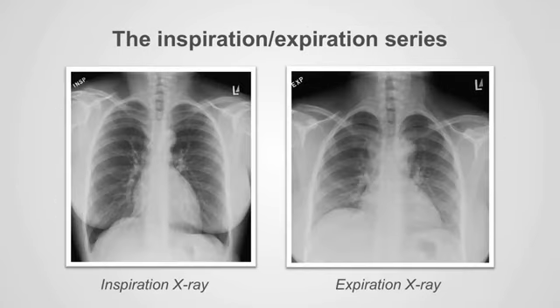When the patient takes a limited inspiration, the opacity of the lungs will be greater than during a full inspiration because there is less air within the lungs. Although in most scenarios this is not desirable, it is used to our advantage in patients with a pneumothorax. By making the lungs whiter, by taking the X-ray during expiration, air outside the lungs in the pleural space will appear more obvious.